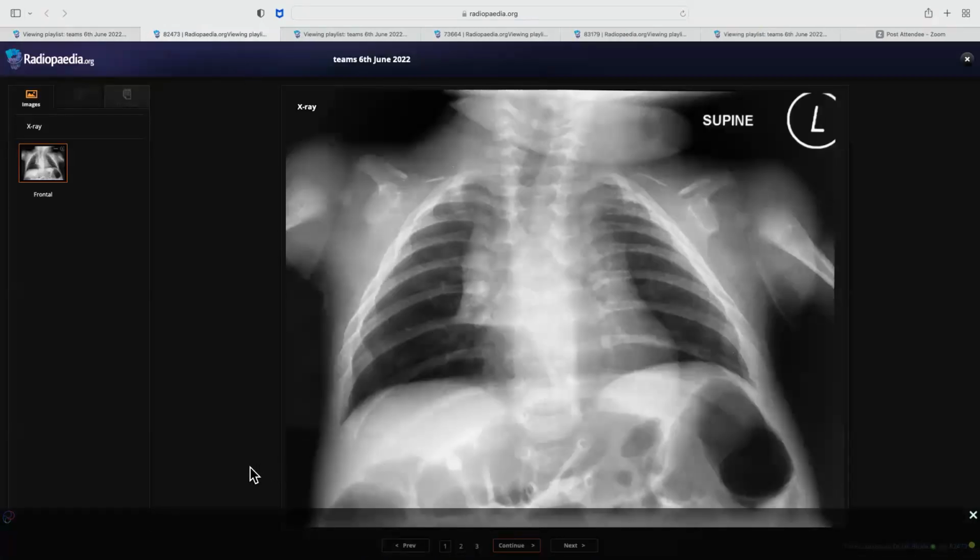Okay. That's your first case. Okay, this is the frontal chest radiograph of a skeletally immature patient. May I know the history, madam? Just a little bit of chest discomfort. Child had some cough. It was just routine, which settled actually.